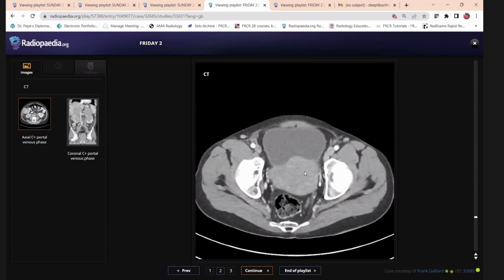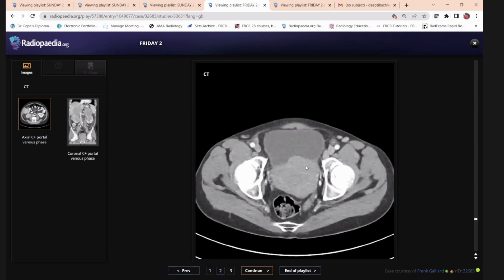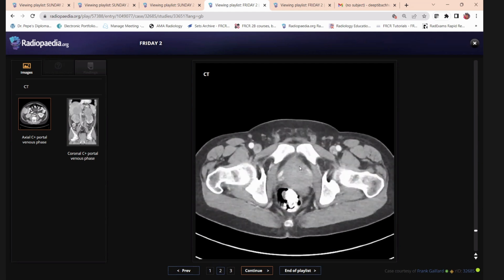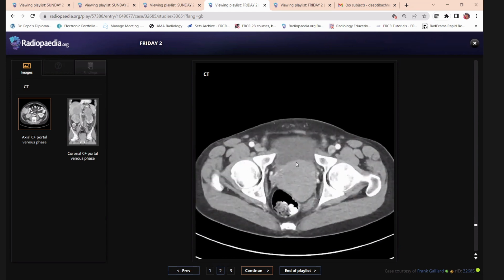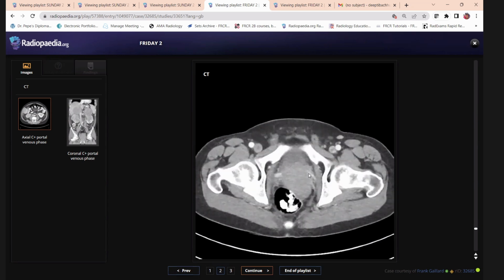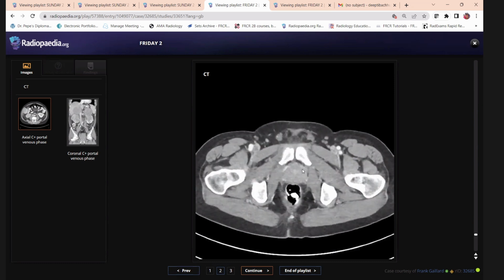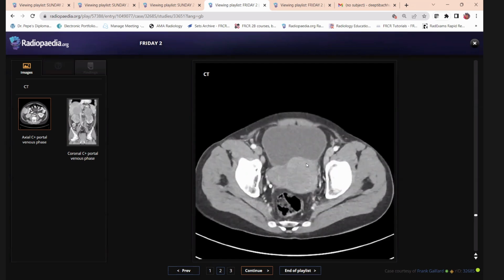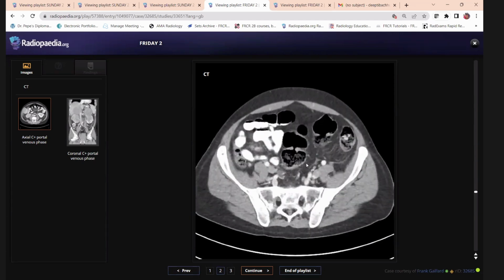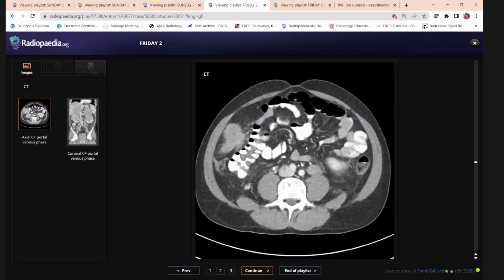So there is a large pelvic mass in the prostate gland, I think. It is indenting the urinary bladder and possibly invading the urinary bladder, as I can't see any clear fatty plane. However, this needs a pelvis MRI for better staging. Any other differential you want to give except for lymphoma? It could represent metastasis from an unknown primary, multiple metastases. It could be the primary renal lesion, and these are all metastases.